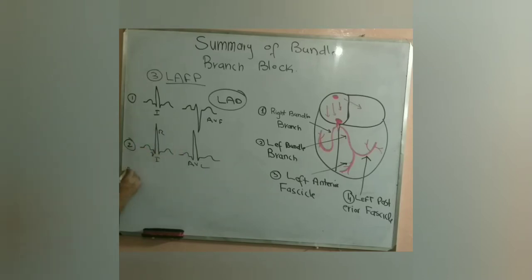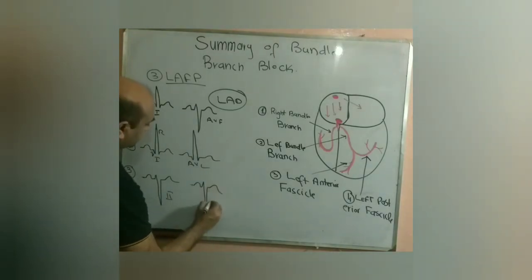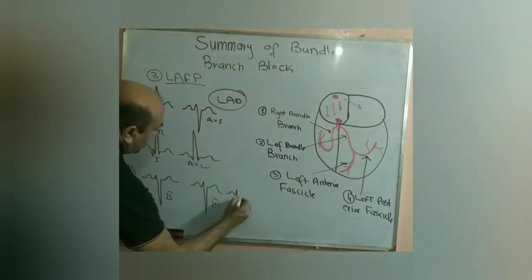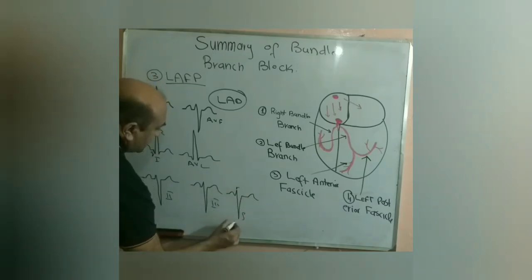And the third condition is there will be a small R and a deep S wave in lead 2, lead 3 and lead AVF.